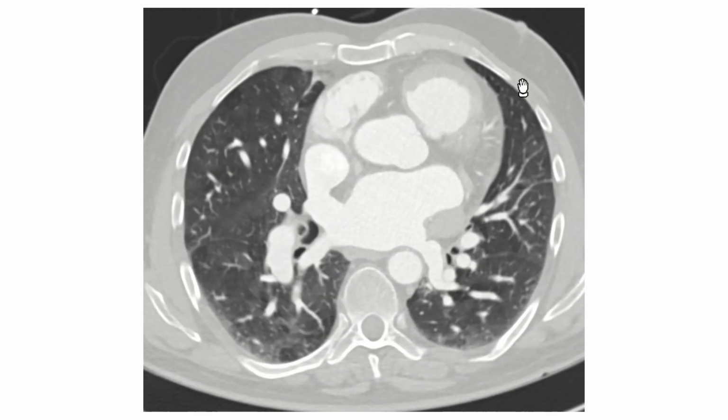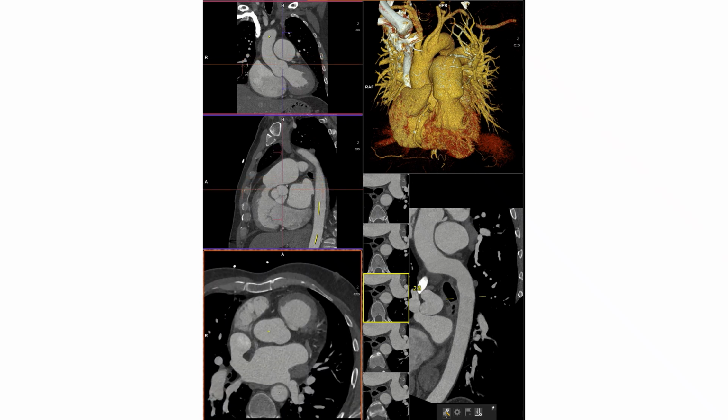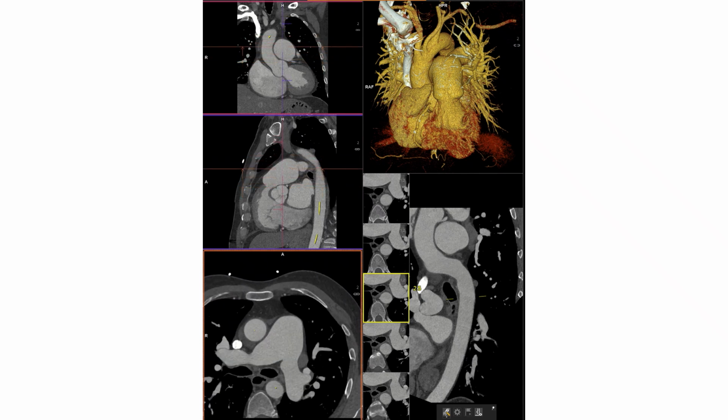So I'll just show some measurements that, if we take them on the CT, might help the clinical team decide whether a percutaneous or surgical solution is appropriate for closure of the sinus venosus defect. How is that? By providing some measurements of the proximal and distal landing zones.